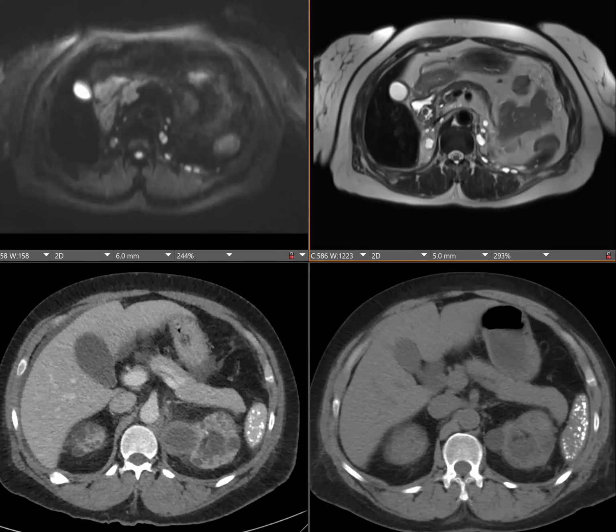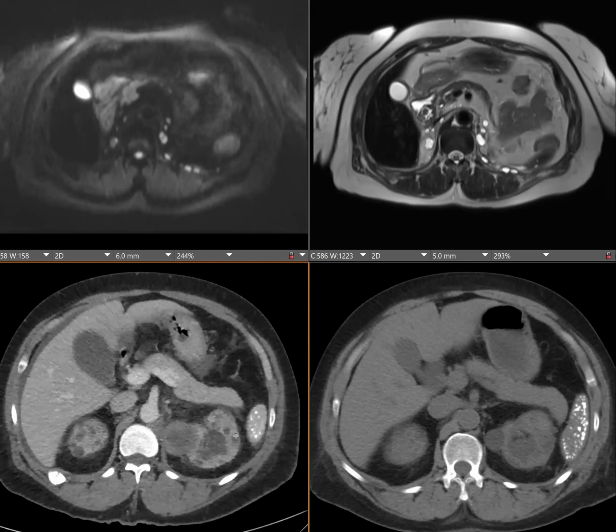Yes. And I think I actually found an AJR article about it. Clear cell papillary, a recent entity with distinct imaging patterns. They basically said there are two distinct imaging patterns, including cystic and solid in almost equal proportion. Oh, wow. So it's a clear cell papillary with cystic imaging appearance.